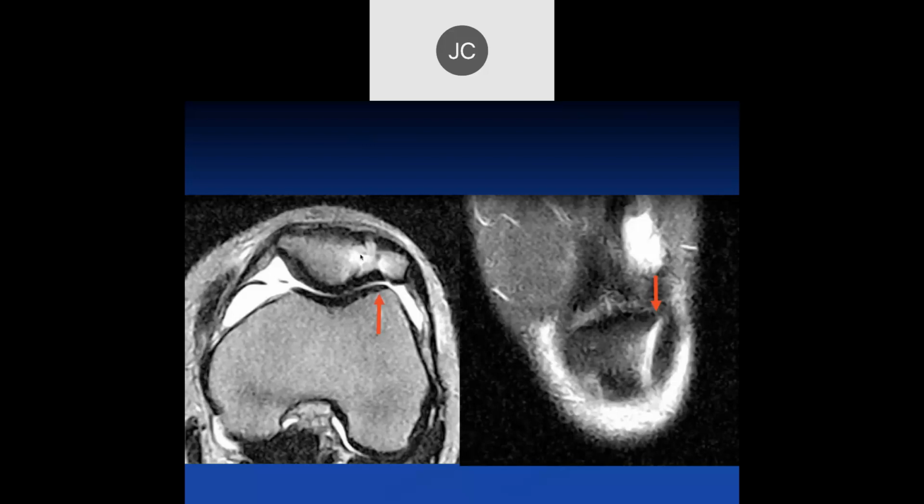Let's say there's no edema in the bone here. You just saw a little separation of the lateral margin of the patella from the central patella, but no edema. I know you can get a defect there. So this was actually a vertical fracture, and here you can see edema within the bone. You see probably a break through the articular cartilage here. Okay, so this is a fracture.